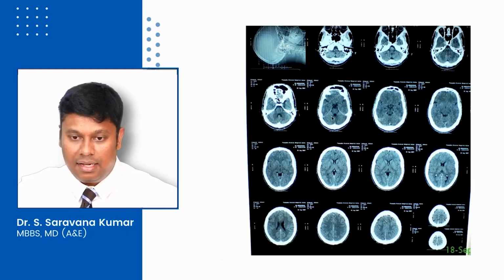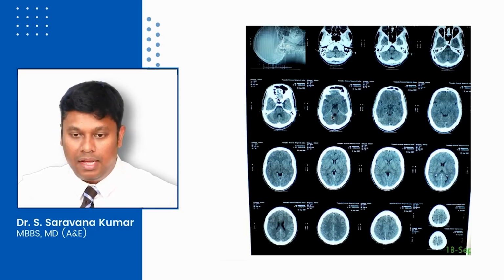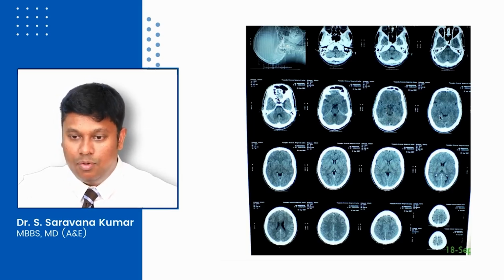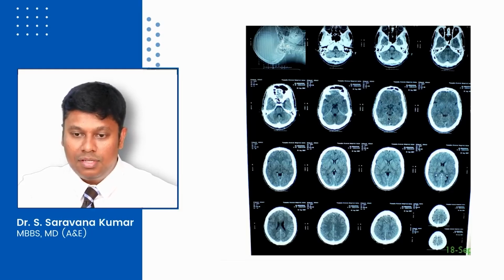As I move to the next slide, I can clearly see we have come above the pons, which is your midbrain. You can see a heart shaped structure in the center, this is your midbrain. And remember our anatomical structure, I just showed you some time back. Above midbrain is your quadrigeminal cistern. Pay close attention to these two images. You can see a smile, a beautiful smiley image. It's nothing but your quadrigeminal cistern or smiling cistern. So the nose is actually nothing but your third ventricle. As we go to the next image, you can clearly see here.